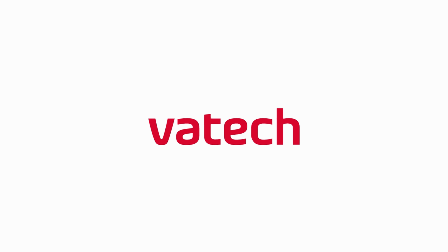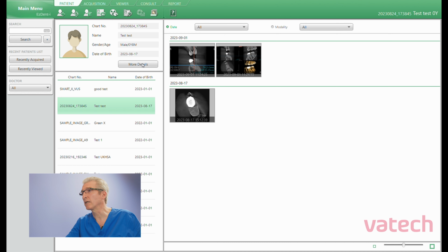There's two programs that we use from Vatech's software. The first one is EzDent-i. It's effectively a patient management system. At the moment, this is set up for tests. So things that we've put into our scanner just to double check that it's working correctly.